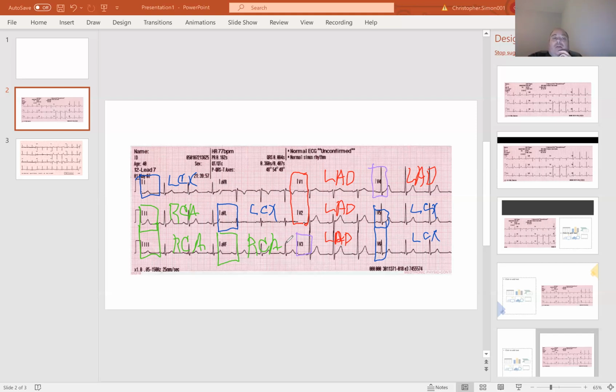But for now, we are going to just look at a 12 lead all the way across. So when I'm looking to diagnose an MI, I'm going to look at this 12 lead and I'm going to look at V1, V2, V3, V4. And then I'm going to look at 1, AVL, V5, V6. And then I'm going to look at 2, 3, AVF. That's just how I do it. Some people like to start with 2, 3, AVF first and kind of do the opposite of what I just did, and that's okay too. You can do whatever you want, whichever is more comfortable. I have a method to my madness, so to speak, which we'll talk about later. There's just a reason I do it that way, and it's just what I like to do. But they're both okay.